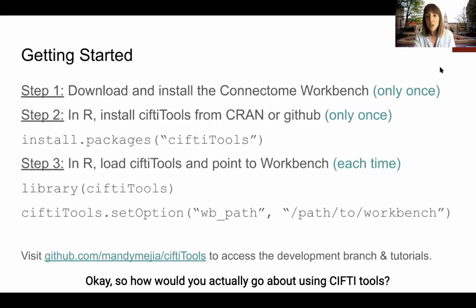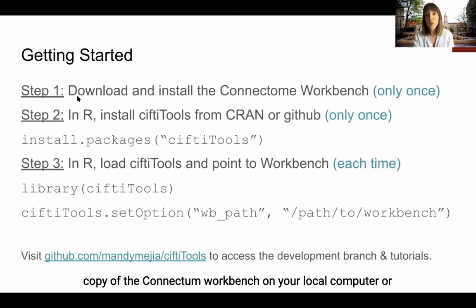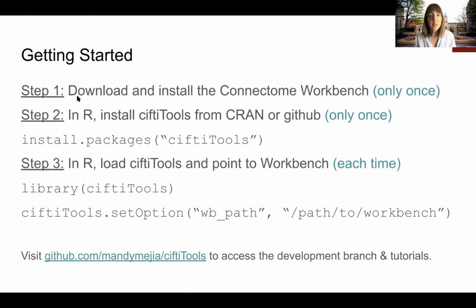Okay, so how would you actually go about using CIFTI-Tools? So first, it's important to download and have installed a copy of the Connectome workbench on your local computer or wherever you're working. And that's because we depend on the Connectome workbench for some of the background features that are key to things like writing and reading, as well as certain processing steps.